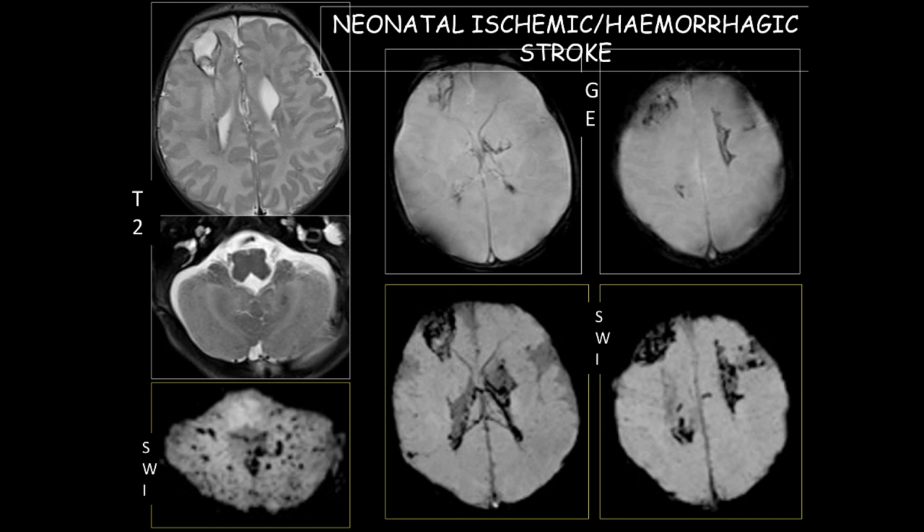What are these microbleeds? Microbleeds are very small bleedings, and in the cerebellum we've got thousands of these small bleedings. This is very important because we cannot think about a trauma or whatever in this child. We're thinking about a systemic condition because we have multiple and bilateral bleeding and stroke events. We studied this child a little bit more.